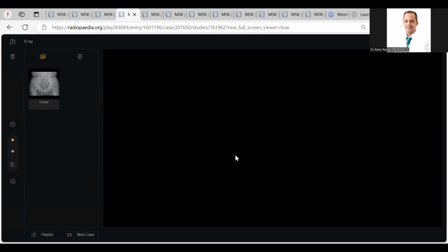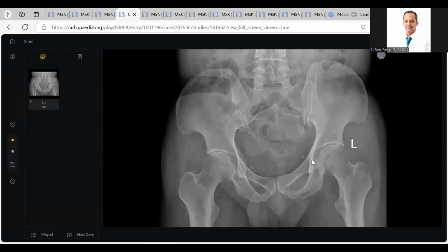My colleague, I repeat again, if you expect this is a normal bone, try to suspect either periosteal reaction or discrepancy in the bone density. Look here, you can't detect well the sacral foramen, and this is the key. Here, this is the sacral foramen, by the way. This is not bowel. This is the sacral foramen. Here, nothing. So there is some abnormality here.